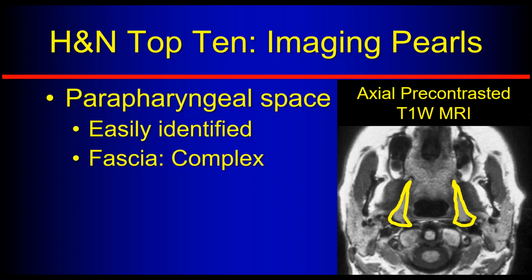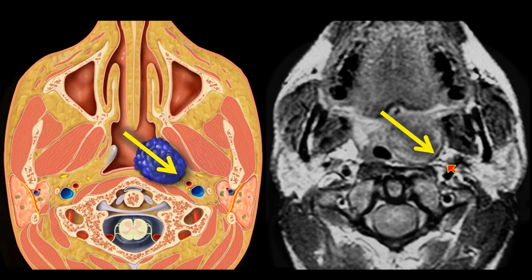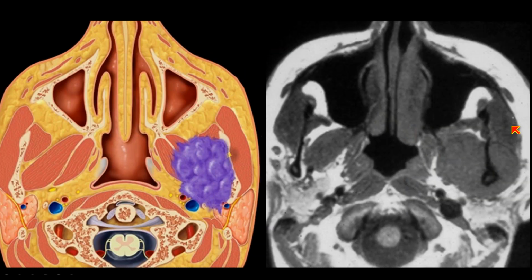And as we talked about last month, where that fat is displaced is very important. If I have a lesion along the pharyngeal mucosal surface or space, I can see how that fat is pushed back posteriorly and laterally when I find that parapharyngeal space fat. If I have a lesion in the masticator space, I know that that fat is pushed medially and posteriorly. So that helps me guess this lesion is arising from the masticator space.